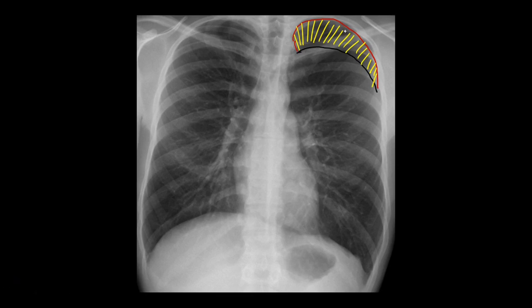Now, although I don't have the precise length of this pneumothorax, if it's greater than 2 centimeters, then as per the BTS guidelines, this will require treatment. We first aspirate it, and if it doesn't resolve, we then insert a left-sided chest drain.